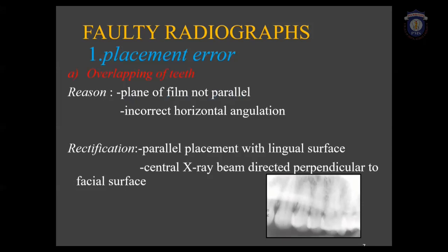So to rectify it, ensure that the placement of the film on the lingual or the palatal surface is parallel to the occlusal plane. The central X-ray beam is directed perpendicular to the facial surface.